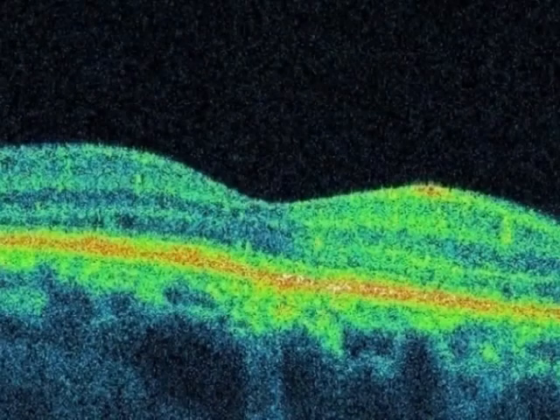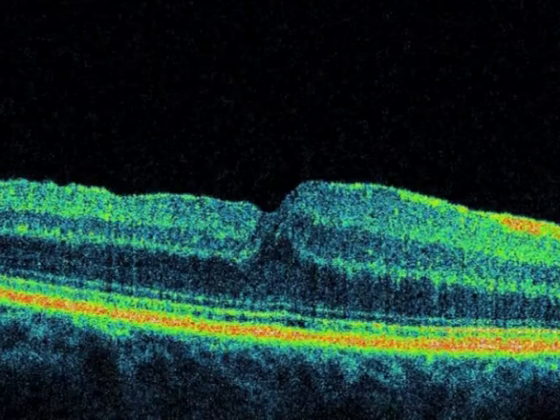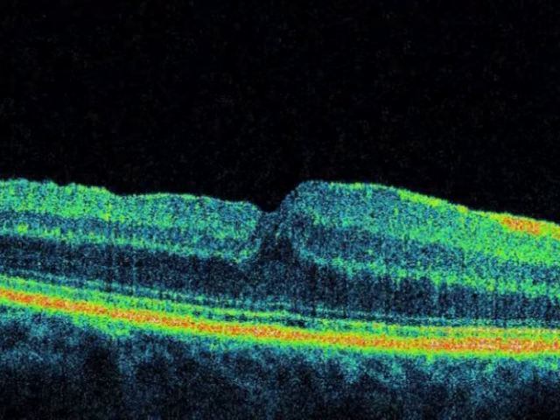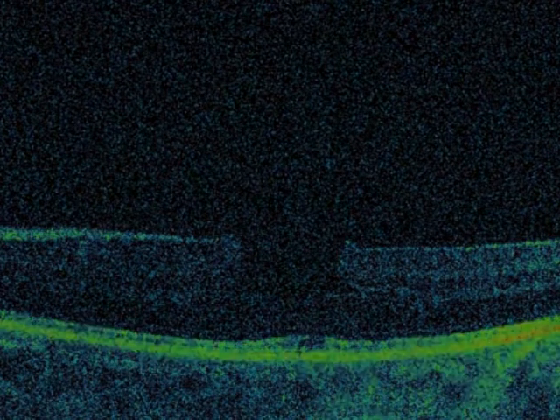After surgical treatment of non-full thickness retinal defects, we may observe the following: normalization of the fovea contour, slight deformation of the macular contour, persisting pseudohole, persisting lamellar macular hole. All are without epiretinal membrane.